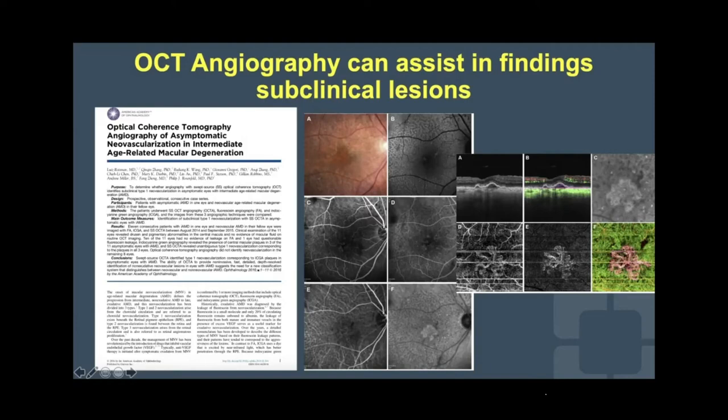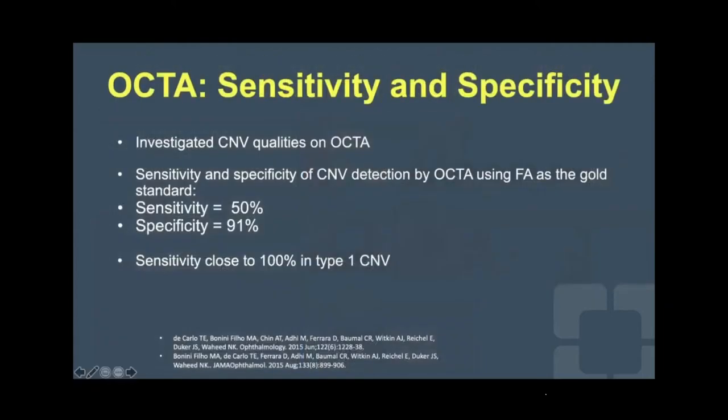And clearly the fluorescein here was not contributory to this. The OCT-A really picked up this patient's sort of outcome.